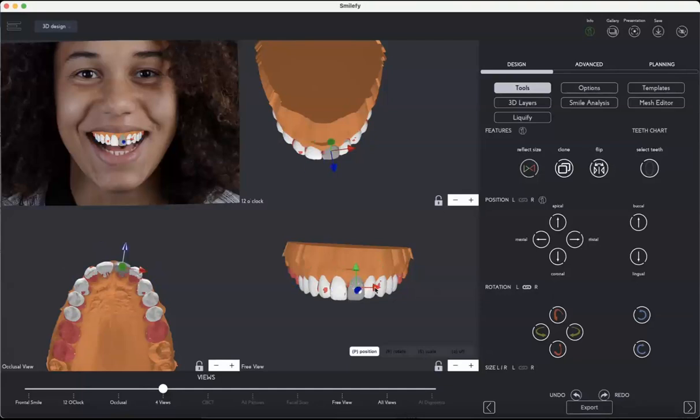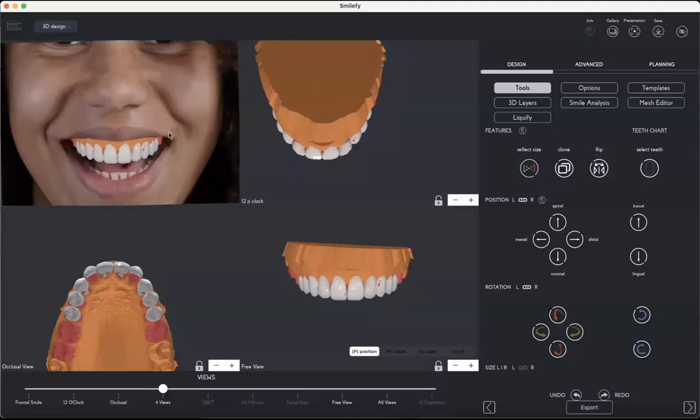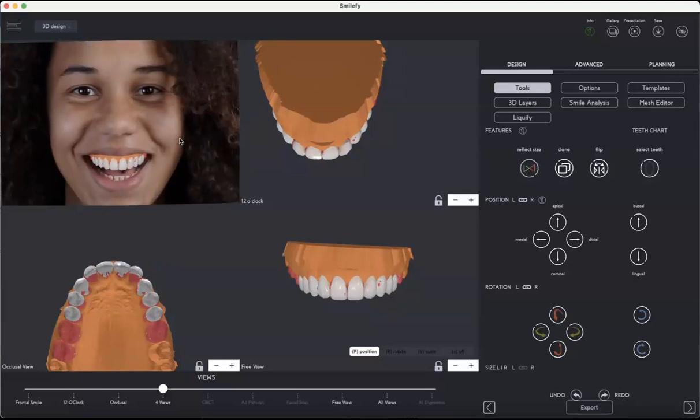As you can see here, we do have small adjustments of the position, interproximal spaces, and sometimes the angulation. We calculate everything in relationship with every single tooth of the patient, and based on the intraoral scan analysis, we find the best position, the best angulation, and so on.